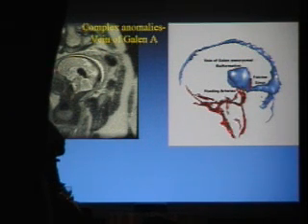And as Pat Burrows from Children's said to me on this case, this is so nice because I don't have to worry about the MRI of the baby after it's delivered because they're unstable, they may be on a ventilator, they may be difficult to image. But this was in utero, where basically the baby's in its own ventilator and its own little incubator because it's still in the uterus, of course. So it's a very nice way to image the fetus when it's stable.